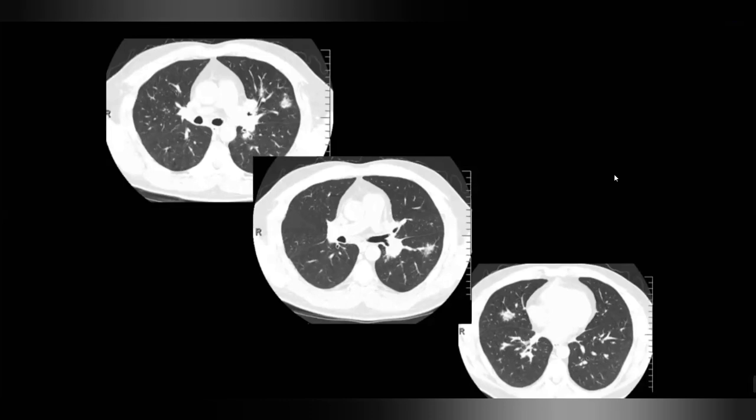Definitely in different clinical scenarios, there are other differential diagnoses. I will show you in the next slide, but you have to structure your differential diagnosis based on the findings. So what's your next step here? Now you mentioned two or three good differential diagnoses. That's fine. What's your next step here? I would go for contrast enhanced CT. What else? Next, I would correlate my findings with labs. I would like to see how much the CD4 count is, and depending on that, I would like to rearrange my differentials.